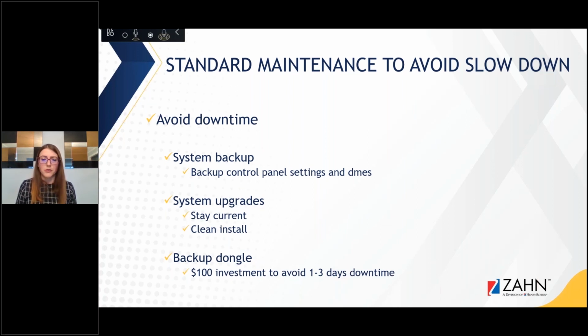So, again, if you've been a 3Shape user for a long time, you will every once in a while run into that instance where you're trying to use an implant library and it's not generating the STL, or it's not giving you the correct scan flag option because it's an old version. So that clean install will give you again a clean slate to import the most current implant libraries that are released by manufacturers, which actually can also be accessed from control panel.